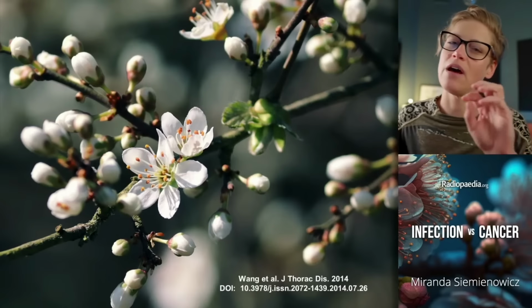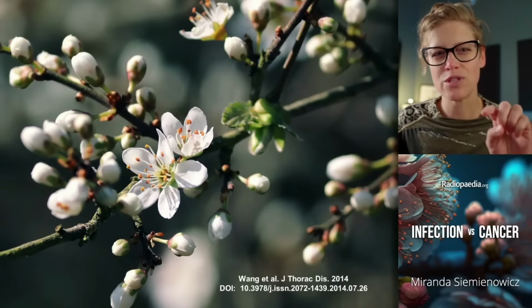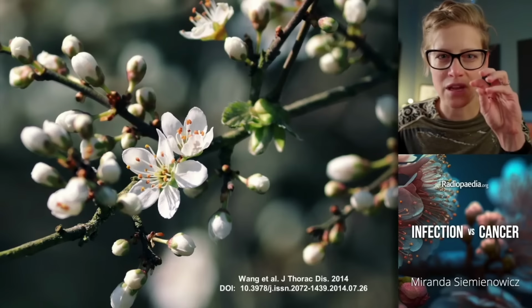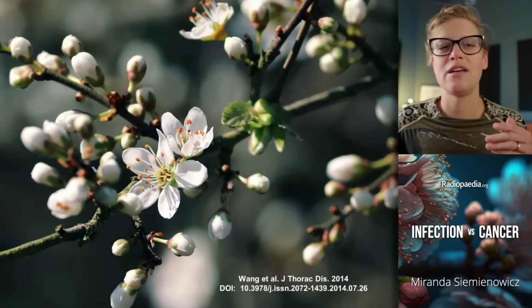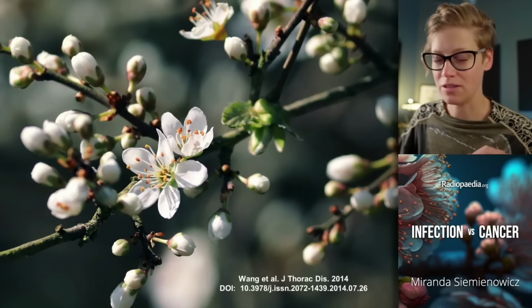So that's talking about the buds without the tree. That's talking about sub-centimetre nodules that arise in a group of adjacent secondary pulmonary lobules. And when they're within that local area as a group, that's a benign morphology, that's an endobronchial spread of infection, and a characteristic that is associated with benign lesions.